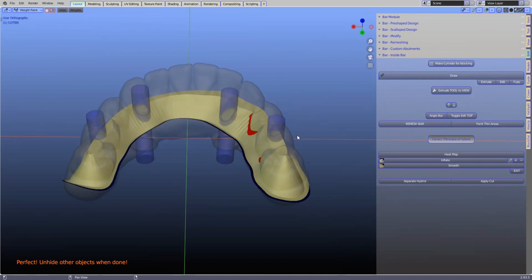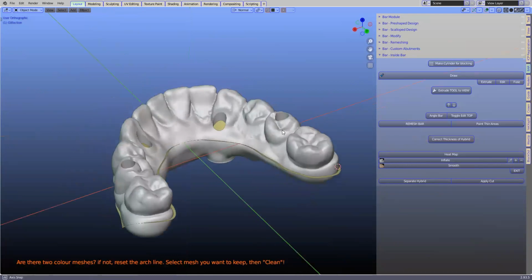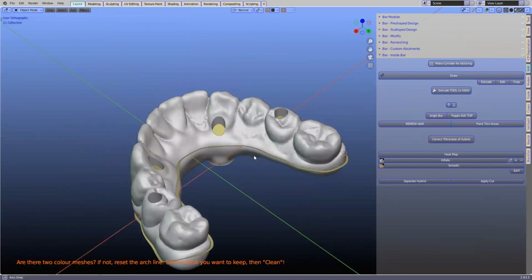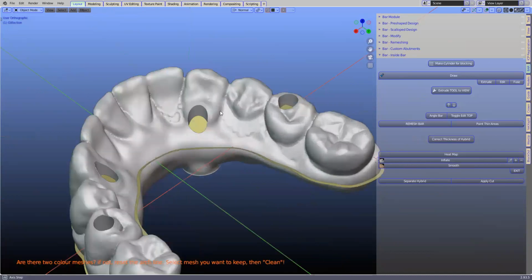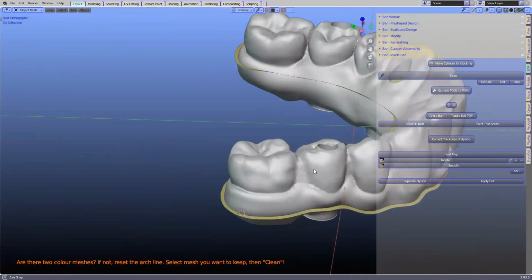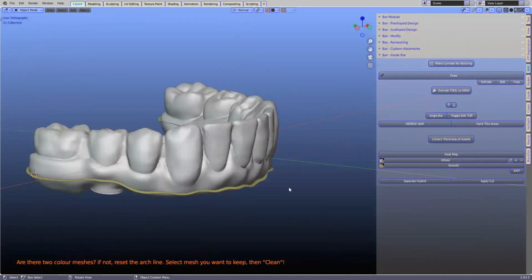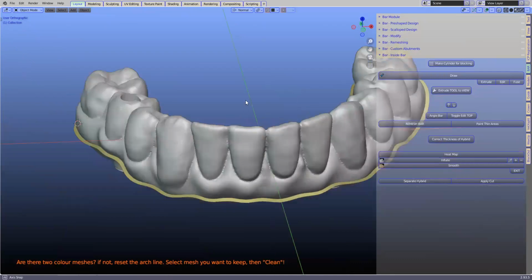Let's click on that. So this takes a bit of thinking, because it's about 1,000 lines it has to go through. So there you go. Wow. It actually did what it was meant to do. You can see it made these areas bigger, you see. It made the areas by, I think, 0.7 or something bigger.